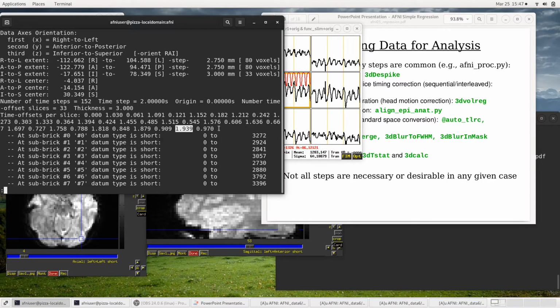So basically, at the scanner, the 2 seconds are partitioned into 0.06 second intervals where during that time you acquire one slice. But adjacent slices are basically half a TR apart in acquisition time. In some cases that may make a difference, in some cases not.